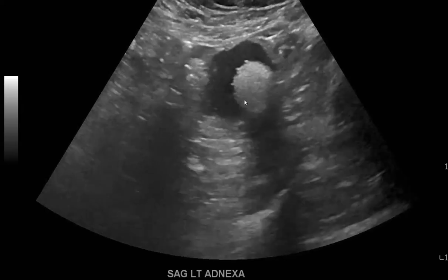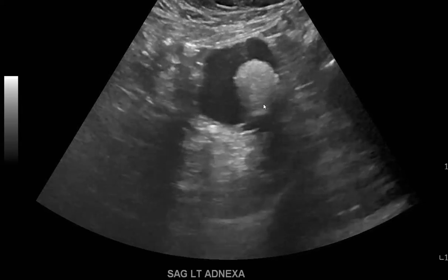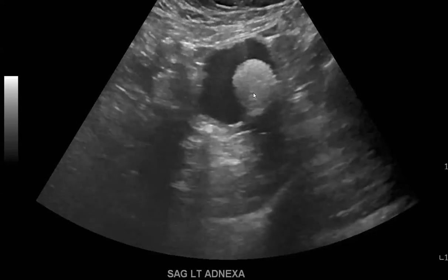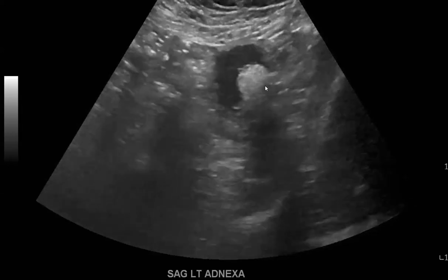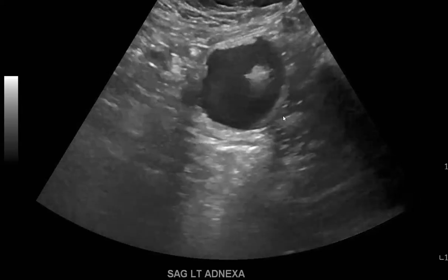So this echogenic structure can contain calcified material such as tooth, or it can also contain a tuft of hair. So it can have all sorts of various materials within it, and it is hyperechoic and shows posterior shadowing.